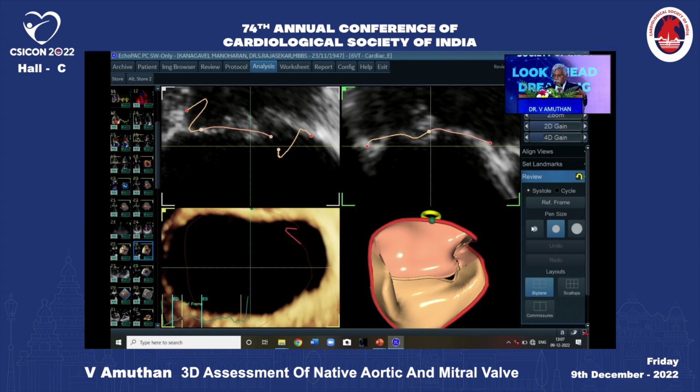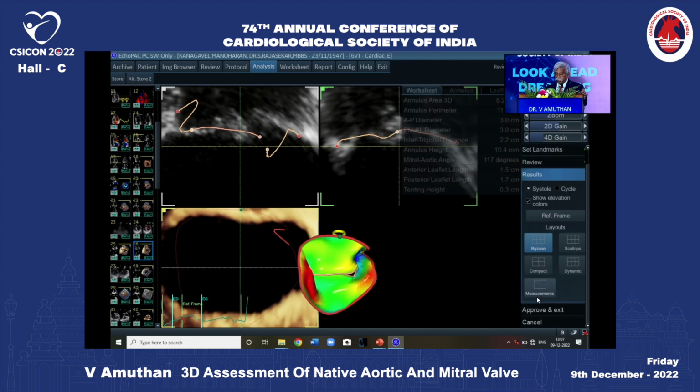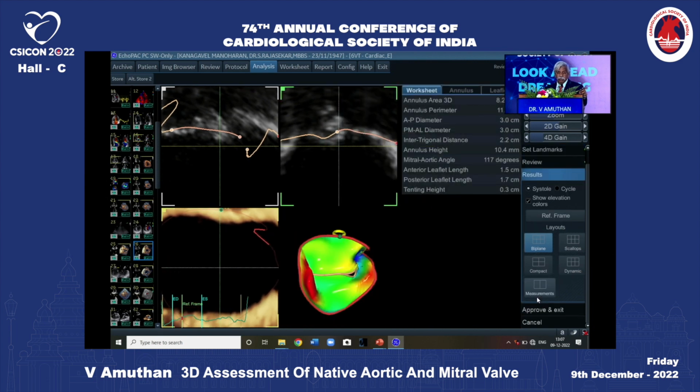So that is how you have that. I am doing this rapidly, and you can have the set results, and you have the results there.